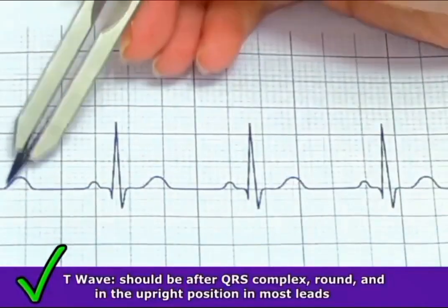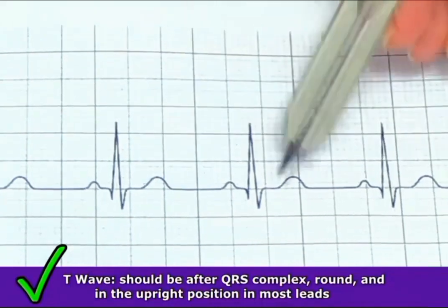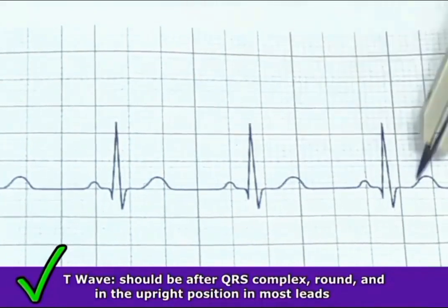Followed by this is the T wave, and the T wave should come after the QRS complex and should be round and in the upright position in most leads.